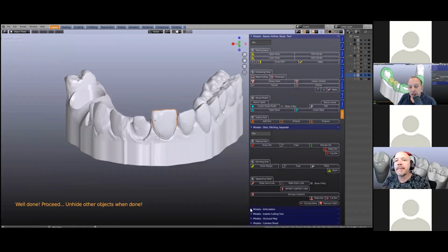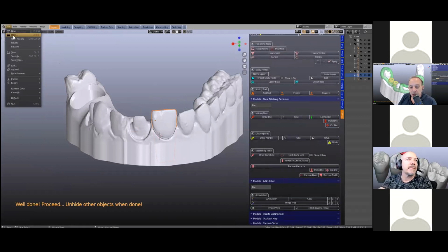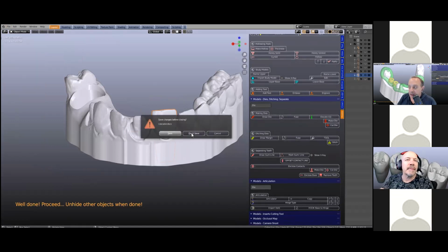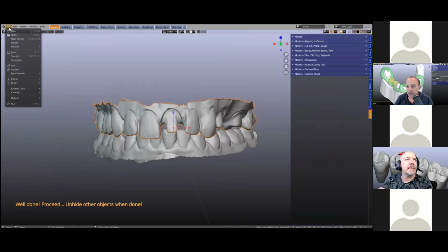Just lastly, just to finish off, could you show us the Verti articulator, quickly import that, and how to make study models? If you can wrap that up in about 2 or 3 minutes.